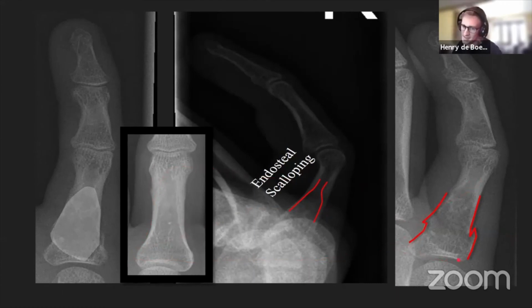So this lesion is beyond the scope of the talk, but it's probably an enchondroma. The most common benign bone lesion in the phalanges is an enchondroma. But I think for any of you reporting these in A&E or as junior doctors, nurse practitioners, things like that, I would say spotting the fracture is the key bit.